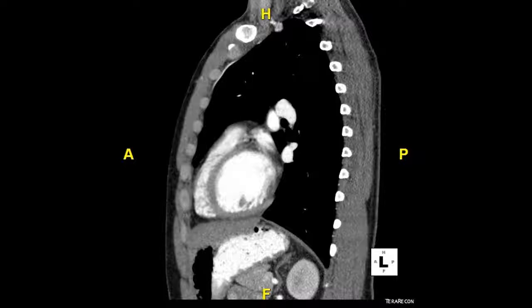In the next few slides, we will start to see some new structures develop, so let's orient ourselves now before we go any further. I'm going to be using a different cartoon image that zooms a little more in on the heart and will show some new structures in detail. We'll then be able to identify these three structures that I'm outlining in yellow right now on that new cartoon image.